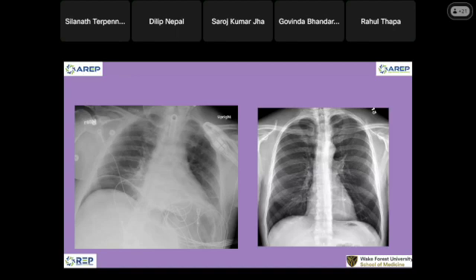One of you asked about the esophagus. This is the air in the esophagus. It's not in the trachea. The trachea is here, but this is the air in the esophagus. So this is an example of pneumonectomy. After we did pneumonectomy, eventually the whole thing will be gone.